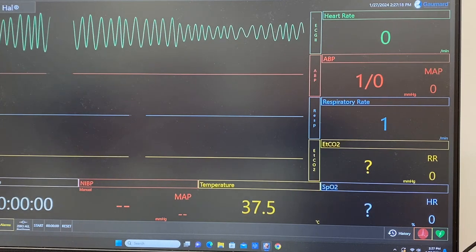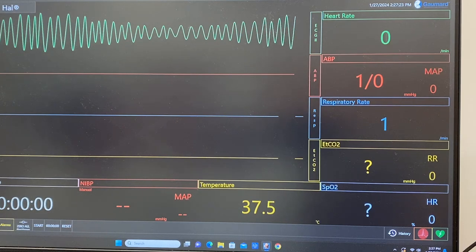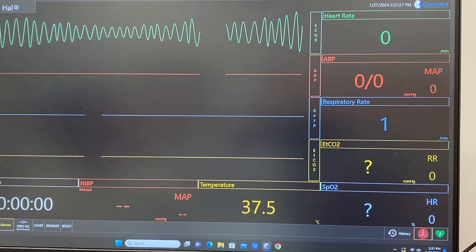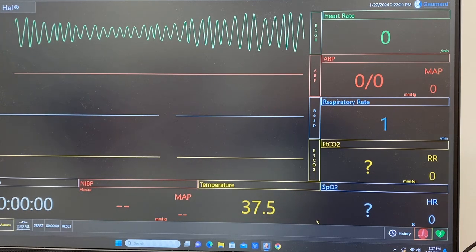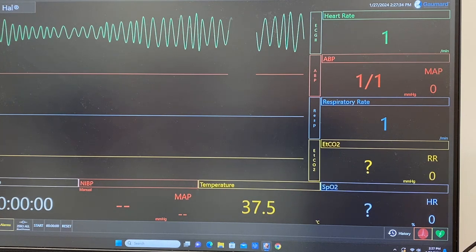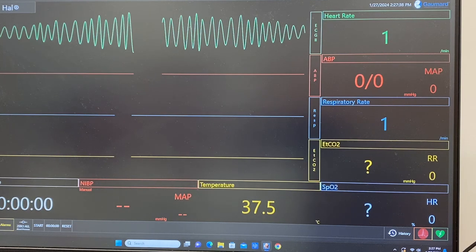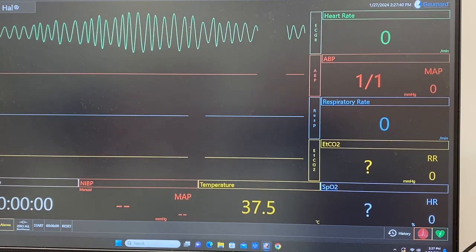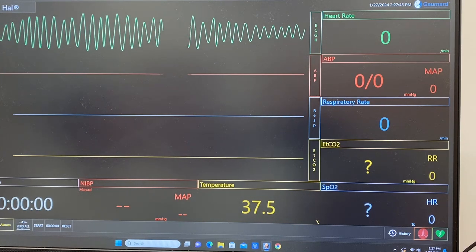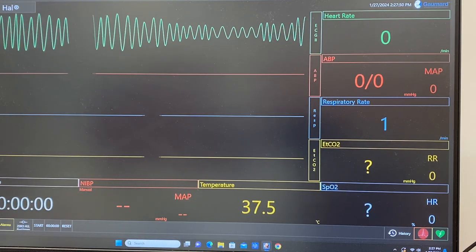Then when you go to the H's and T's, which are the possible causes of a code, you know that for Torsades, you're looking at the hypos. First is hypomagnesemia, hypocalcemia, hypokalemia, and then again drug toxicity. Those are the things that you would associate with that, and it's a classic pattern. So you see the party streamer. Nice. Let's see if there's any more.